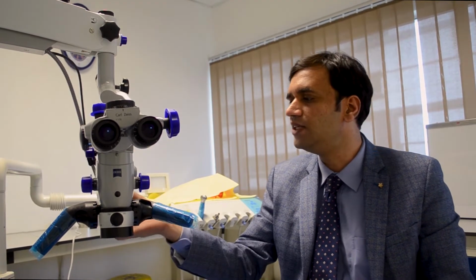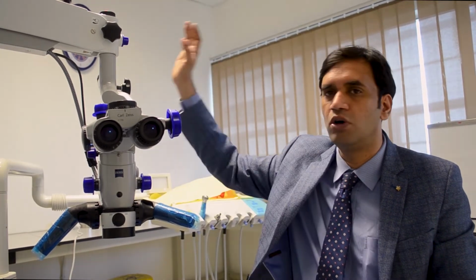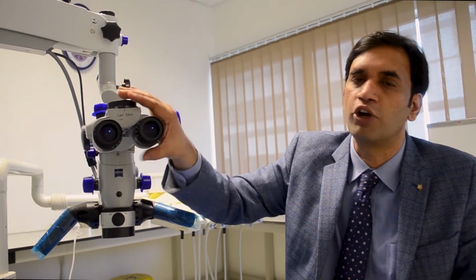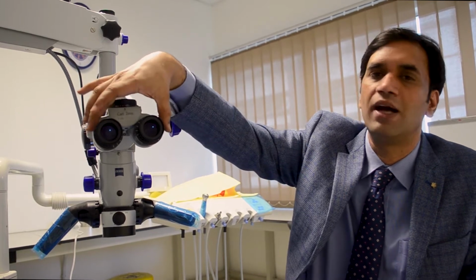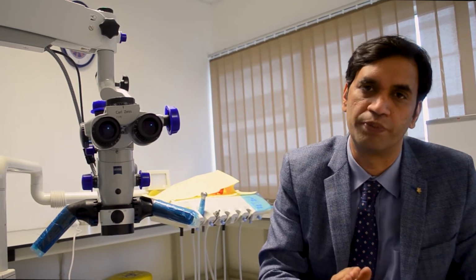So you have this body of the microscope where it is attached to these cables which you see. These are the cables which transmit the signal, or whatever you see under the microscope, to the monitor. That means you can simultaneously see the picture on your eyepiece, which I will discuss later, and also on the monitor. And the third main component is this particular binocular where you've got the eyepiece. So the three components together make the major crux of an operating microscope.